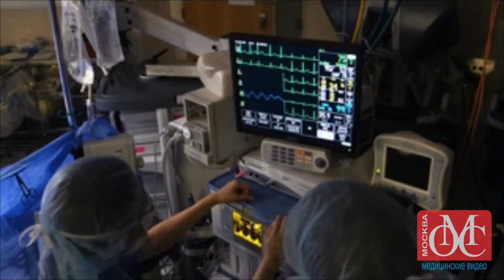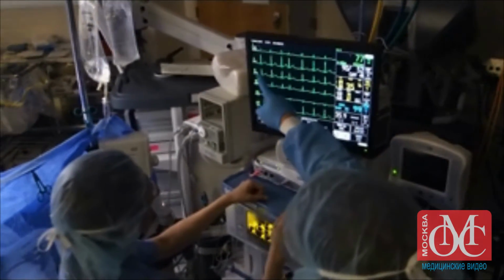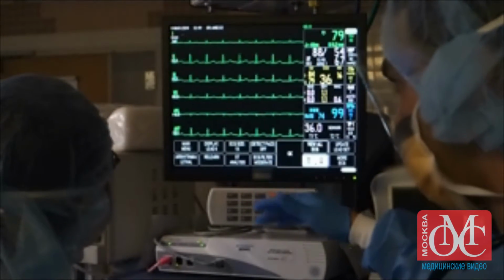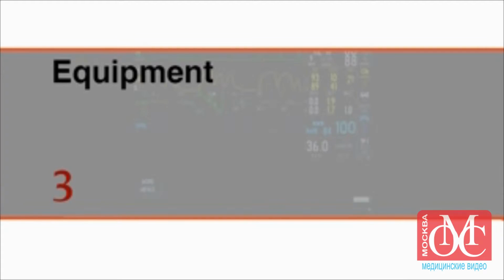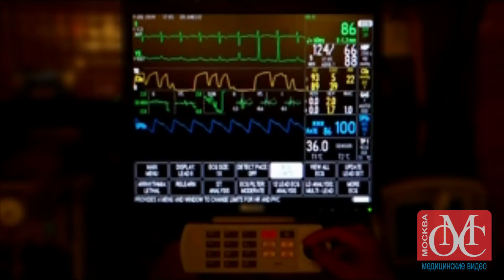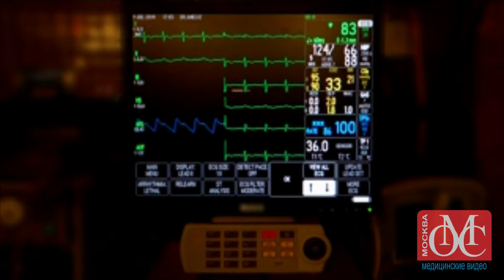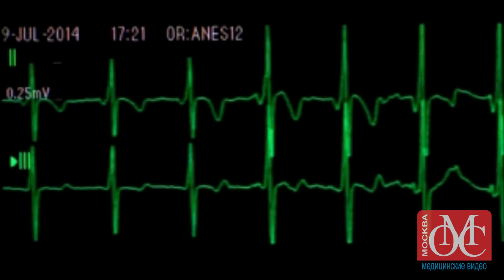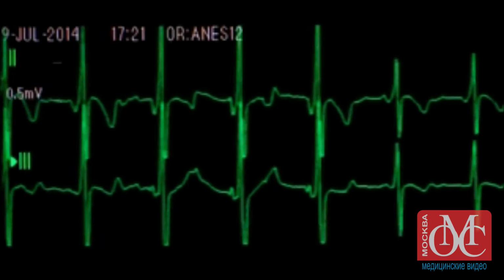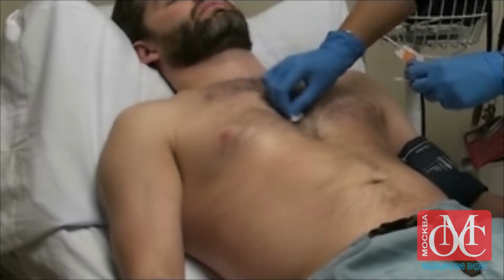However, because of the potential for undertreating or overtreating the patient on the basis of ECG data, the clinician should enlist the help of more seasoned clinicians when appropriate during recording or interpreting the ECG. Most ECG monitors display 1 or 2 waveforms at the top of the screen. If desired, additional waveforms can be displayed. A menu on the monitor may allow modification of the amplitude of the graph to optimize viewing of waveforms. In addition to the ECG equipment, you may need alcohol wipes and a razor.